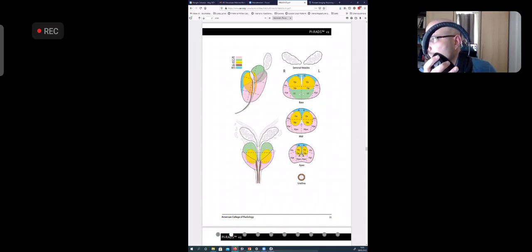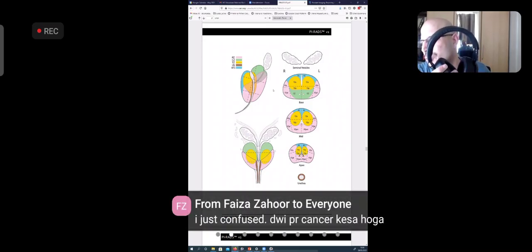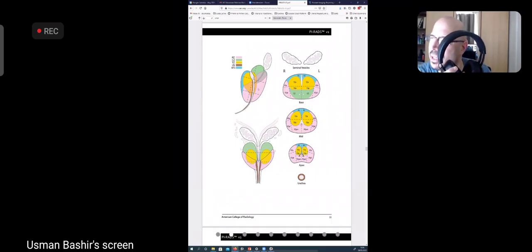You split it up on the axial view, so you get a rough approximation. You go down and up on the axial view and get an idea whether it is in the middle, apex or base. So these are the three bits: base, mid, and apex.